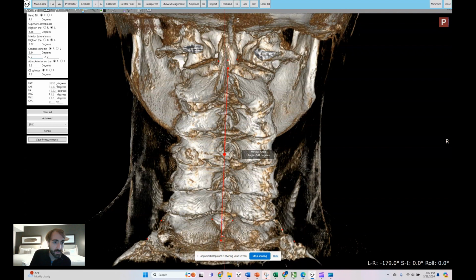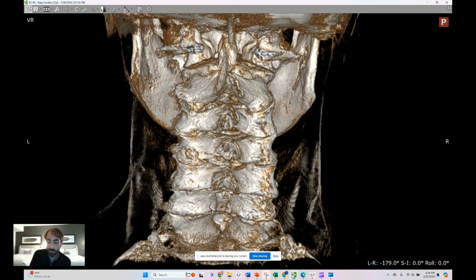For a very tight misalignment with plenty of rotation, but very tight. So we'll check all of that in a second. C over A is kind of our last measurement. Refresh.